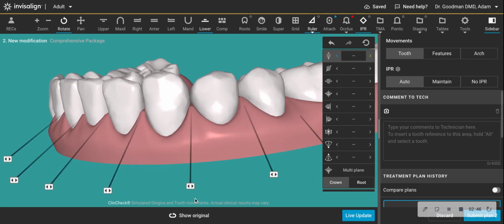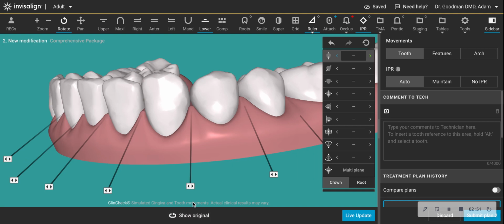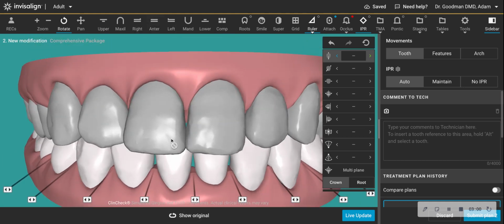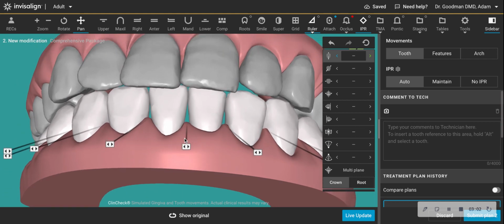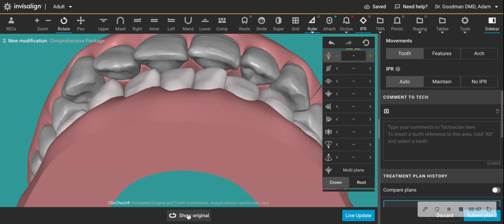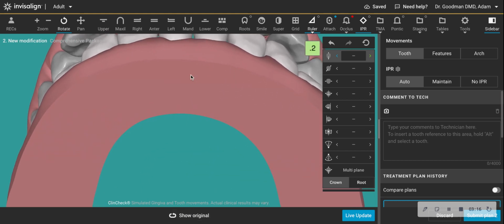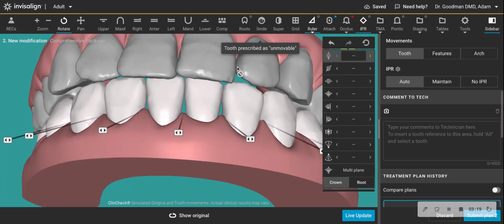But this is a very difficult movement for aligners and maybe even for braces, because what you're seeing is the lower arch is intruding, but not really coming forward that much. And so again, the overall reduction of the overjet, remember, I did not move the uppers forward because I wanted to make this point. I showed you in the occlusal view that there seemed like there was forward movement, but it doesn't really seem like there's a reduction in the overjet that you might think would happen with, say, a reverse curved wire where you get some flaring of the lower incisors.